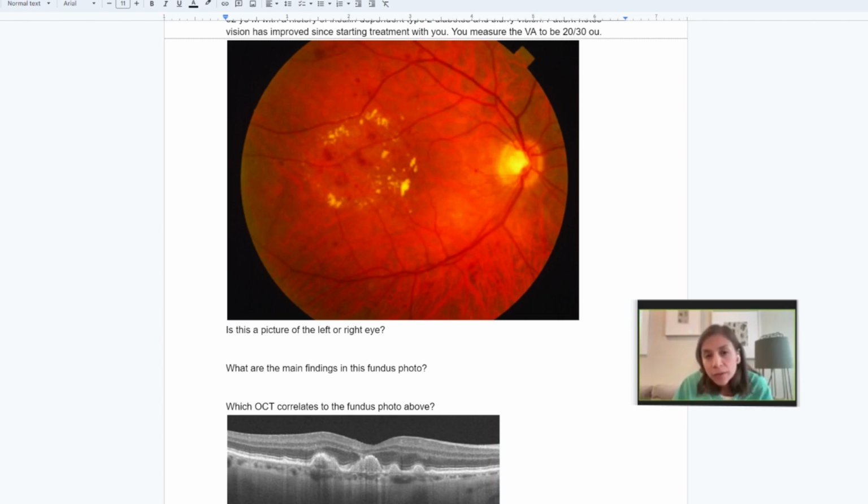I noticed that somebody on the answers commented that it looked flat. You can really not comment on a fundus photo if a lesion is flat or not, because you really don't have a 3D, right? This is a 2D image, so you can't really comment on thickness. However, some clues about thickness can be given by the blood vessels that go over the lesion. If you see a bend on those blood vessels, you assume that the lesion is elevated, but that's only if the lesion is really, really elevated. So it's hard to comment on fundus photography if a lesion is flat or not.